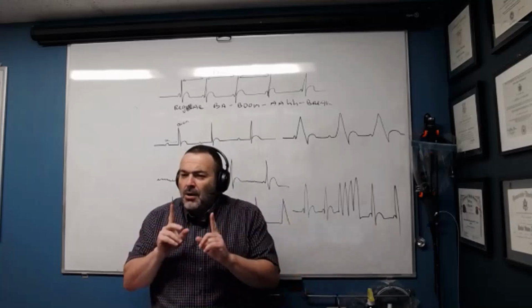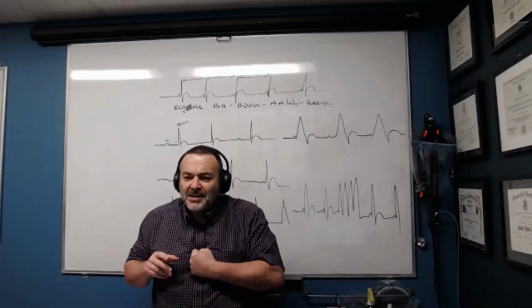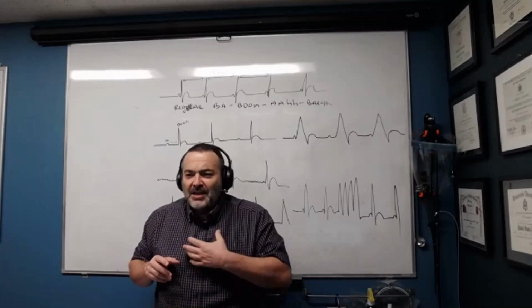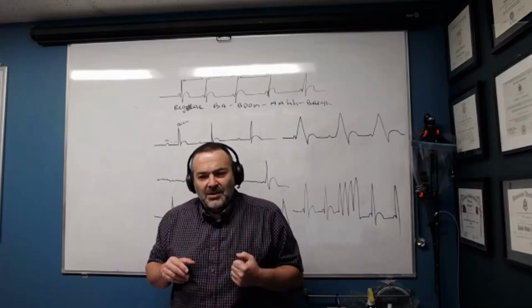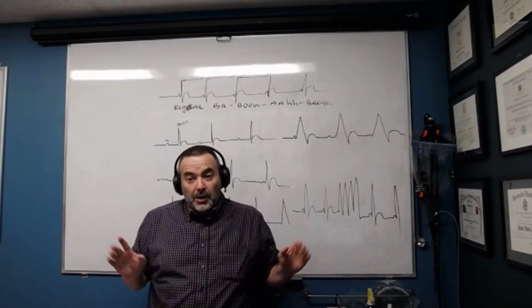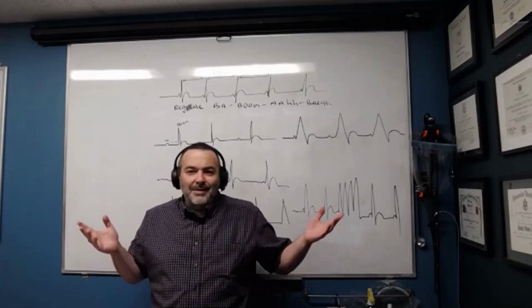Is that good? No. That bottom part of the heart seems to be having a hard time squeezing. It's just not squeezing as sharply and crisply as it's supposed to. That's not good. It's supposed to be ba boom, ah, break. No, this is ba boom, ba boom.